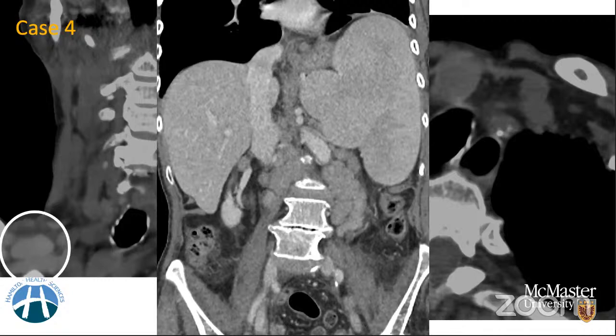They can go beyond that, as you see in this particular case, they can go into the mediastinum. Inguinal lymphadenopathy is not usually common because, as you're aware, the lymphatics which drain into the inguinal nodes are usually from the superficial skin, the scrotum, the penile region, all of that region. So whenever you see inguinal nodes in a patient with a testicular mass, you should start suspecting that probably the mass has eroded the tunica and is trying to involve the scrotum, and that is why the disease is spreading into the inguinal nodes.